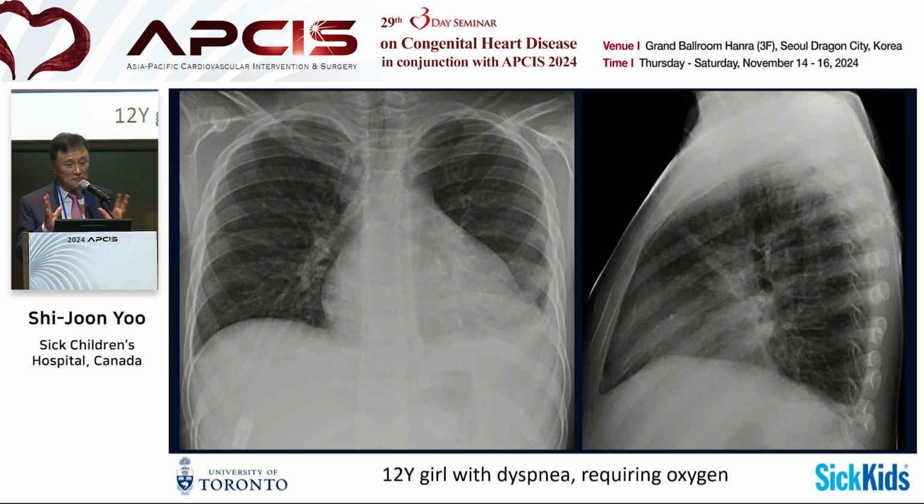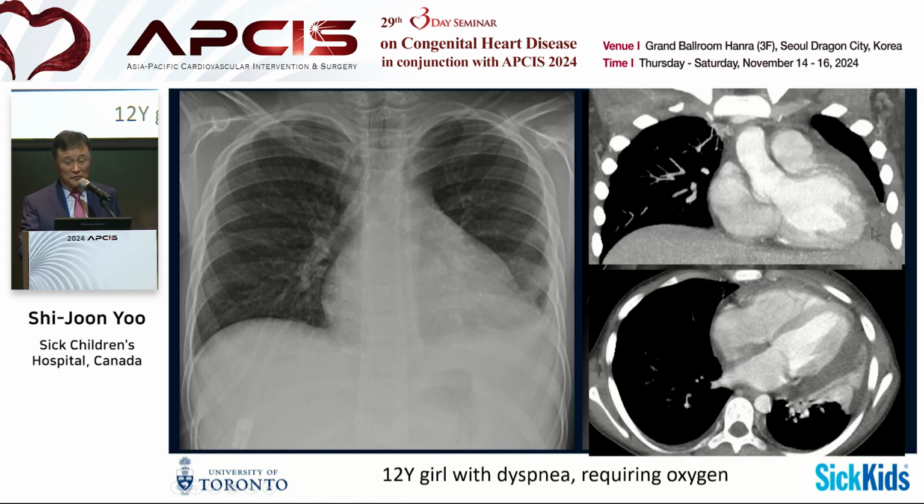Here you have your silhouette rather large. But silhouette is pencil sharp, very, very clear, okay? And then this is a very strong telltale sign, especially when it is associated with pleural effusion, pericardial effusion shown here, okay?